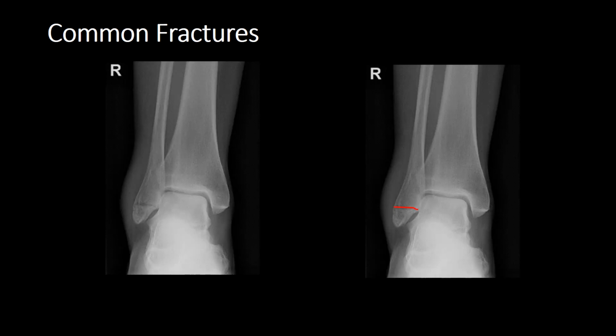Okay, so here we have a transverse fracture through the lateral malleolus, with adjacent, look at that lovely soft tissue swelling, or well, the patient probably doesn't think it's lovely. The important thing with this injury is that we can see that it's inferior to the tibiofibular syndesmosis. And what this means is that the mortise joint is still preserved. So the medial malleolus, which is intact, is still preventing the talus from moving in a medial direction.